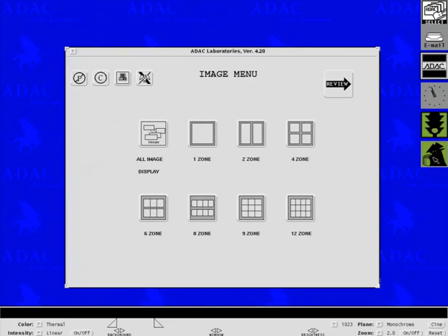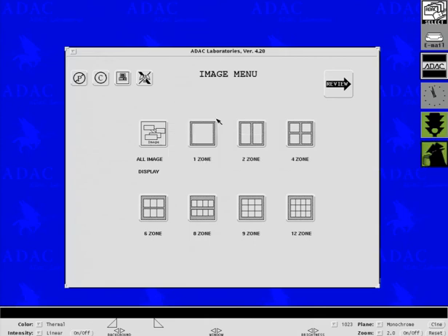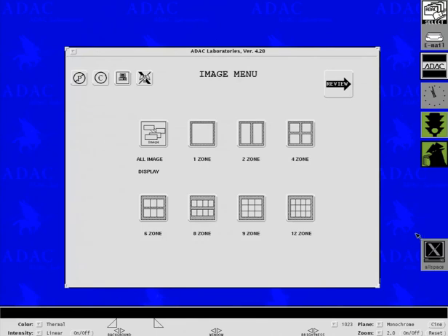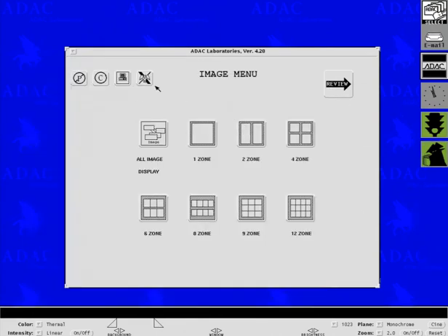The next icon down is our disk spy guy. It is telling us how much drive utilization there is for patient space. You notice we got 3%, we have approximately 4.5 gig of space available. Up here, we also see we had about 4.5 gig available. We have a capacity of 3%. So again, we want to quit that, or we close it with hitting return.